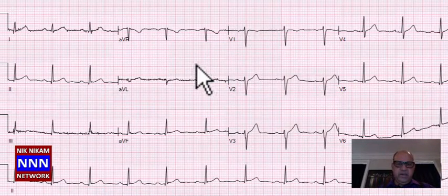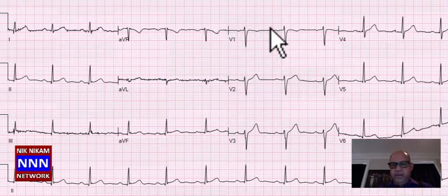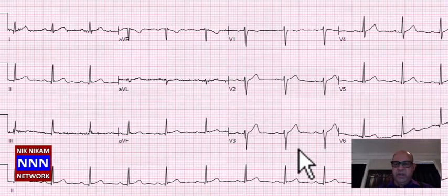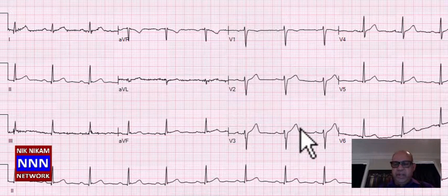Here we have a nice sinus rhythm, good R wave progression in the inferior leads. In the anterior leads, there is some lack of R wave progression. Again, this may be related to lead positioning, and it is very important, especially if you are a technician, to make sure that if you see poor R wave progression in the anterior leads, you place the leads at least 1 space below and repeat the electrocardiogram so you can see a difference. If you see a difference, that means this lack of R wave progression may have been related to the lead position.